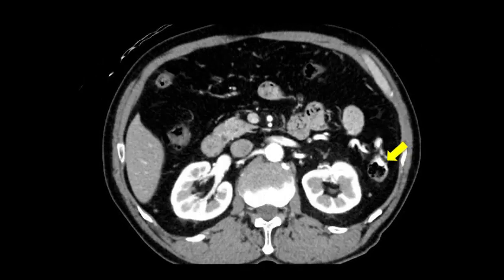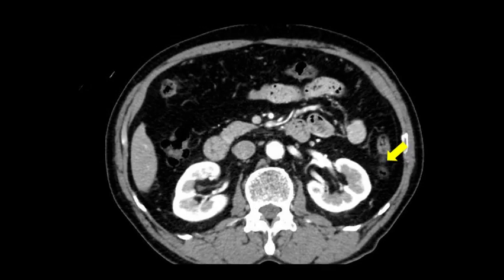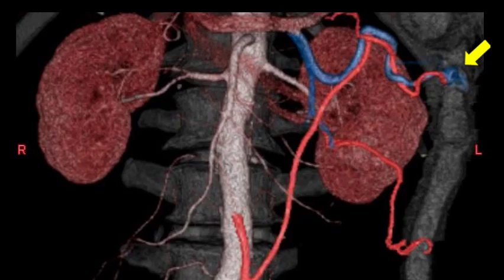Contrast-enhanced CT scan revealed accumulation of abnormal vessels in the splenic flexure of the descending colon. 3D reconstruction of the CECT showed that blood flow to the region was supplied from the left colic artery and the left colic vein.